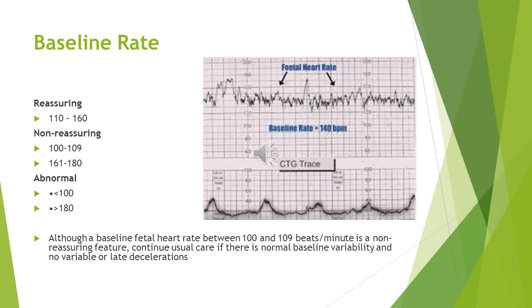For example, a baby can start at a heart rate of 120 or 130, and then the midwife calls you to interpret the CTG 2 hours later, and you find 140 or 150. The number is still reassuring, but if you compare it to the starting baseline, it's a rising baseline, which can signal an early onset infection. So you have to take care about what was happening before the time you are coming to interpret the CTG.